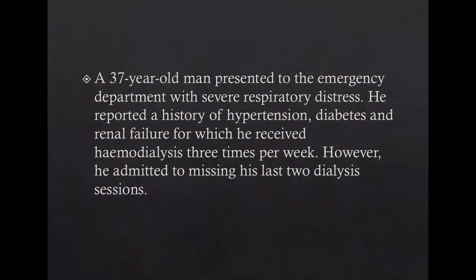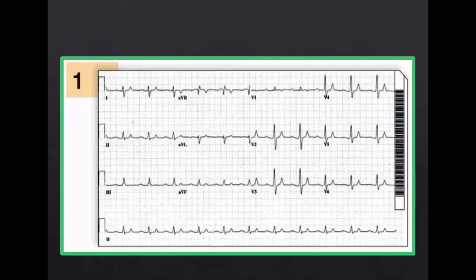So let's go through a case. A 37-year-old man presents to our emergency center with severe respiratory distress. He has a history of hypertension, diabetes, and renal failure, and receives dialysis 3 times per week. However, he admits to missing his last 2 sessions. And this is his ECG.